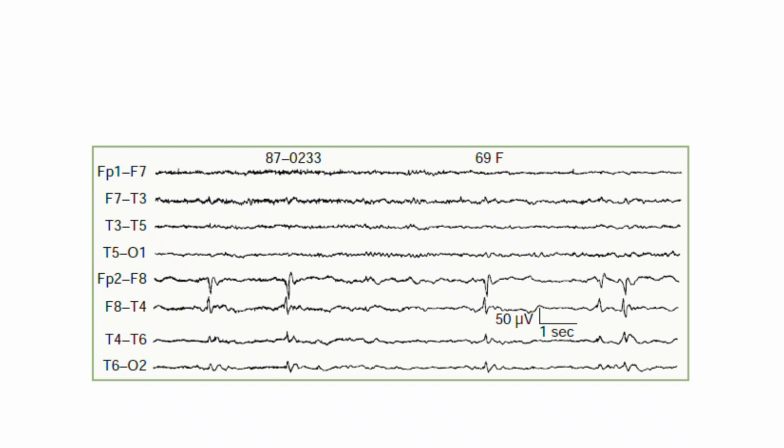To localize a focal spike in a bipolar montage, we look for a phase reversal, the visual phenomenon where the waveforms in 2 adjacent channels point toward each other, acting like arrows pointing directly at the source of the electrical current. Look closely at the second and third major sharp discharges in the right hemisphere channels. In channel FP2-F8, the spike deflects sharply downward. In channel F8-T4, the spike deflects sharply upward.